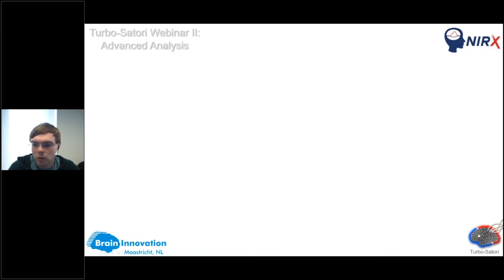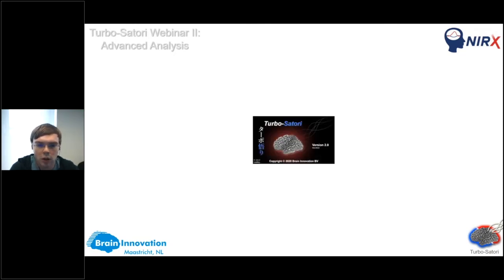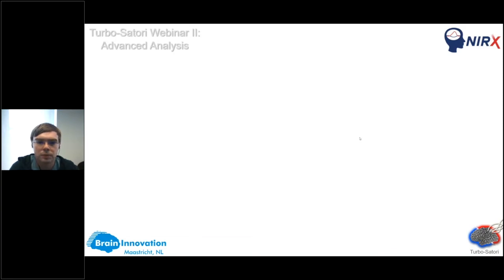Okay, so let's start Turbo-Satori. If you start the software, you basically have two options, the real-time and the simul mode. In the last webinar, we mainly used the real-time mode. Today, because I don't have a device connected, I will focus on the simul mode. It's basically simulating data analysis from an already acquired data set, using NIRScout, NIRSport 2 or NIRSport devices. You can just click on this button and then it will load the application.